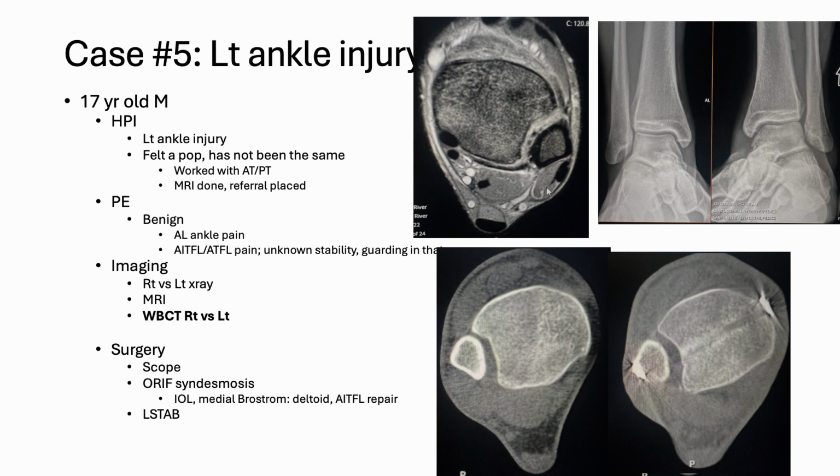With the 2 tight ropes, the syndesmotic area looks much more normal compared to what it did preoperatively. I think it looks great, in my opinion. I think I did a good job. That's me tooting my own horn, but this is what I wanted to see, getting a weight-bearing CT scan after. He had some continued pain, mostly from hardware around the distal fibula, the plate that I used. He wanted his peroneal tendons not to irritate, so I just wanted to make sure that I had good correction, that I didn't give him malunion or malalignment of the syndesmosis after surgery.